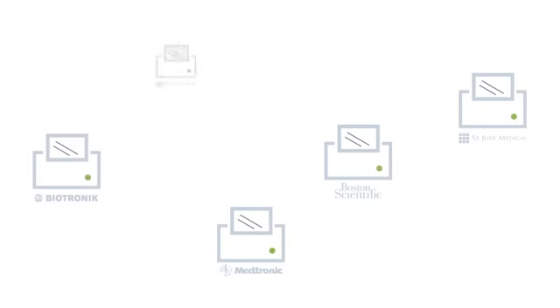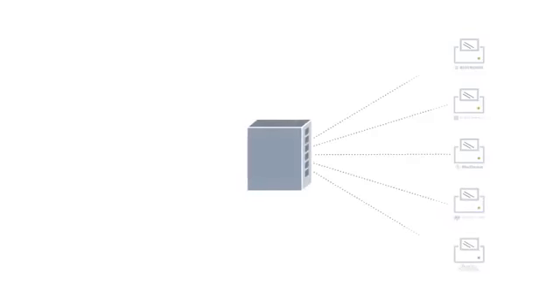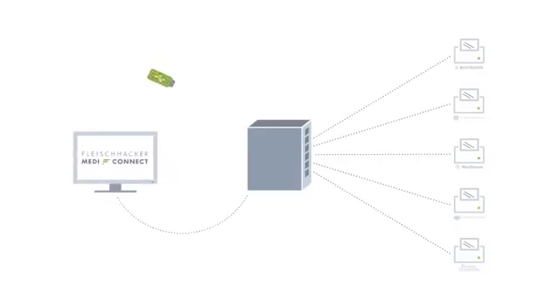Now let us look more specifically at how users can operate MediConnect. Normally, follow-ups are conducted with the different manufacturers' programmers, which are connected to a workstation with a switchbox, which is also linked to the USB stick. The aforementioned hardware setup supports the ideal workflow for executing a pacemaker examination.